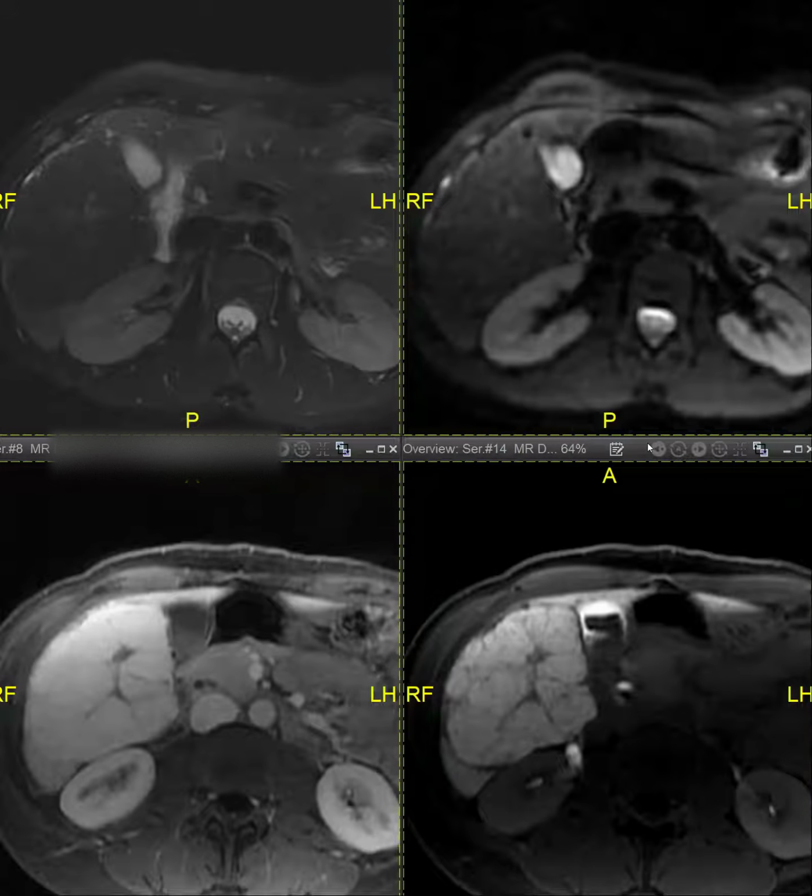Ranging from 11% to 59% of adenomas show iso- or hyperintensity on hepatobiliary phase. The beta-catenin ones show up to 59%, but the unclassified ones show about 11%. So this is what I'm showing. The first case I showed was a beta-catenin mutant, right? Yeah, so it did retain contrast.